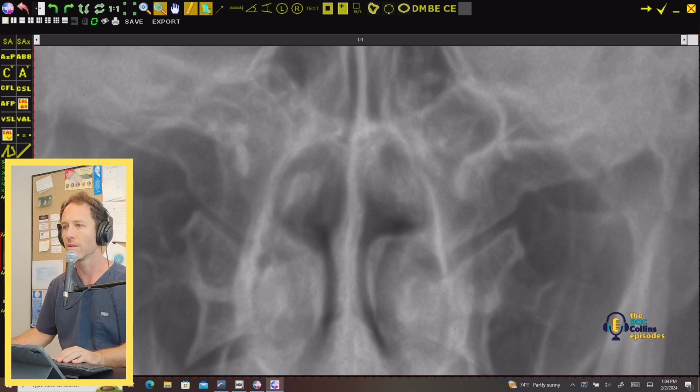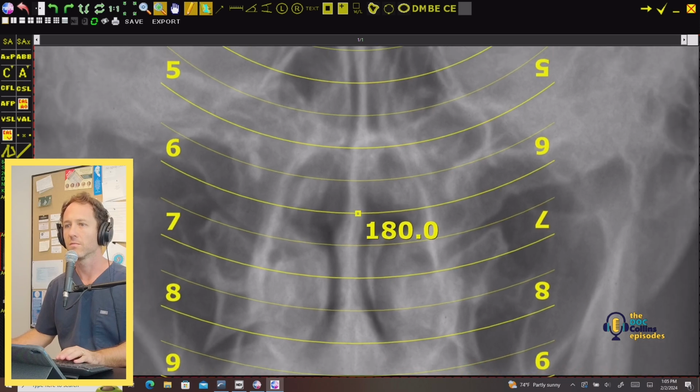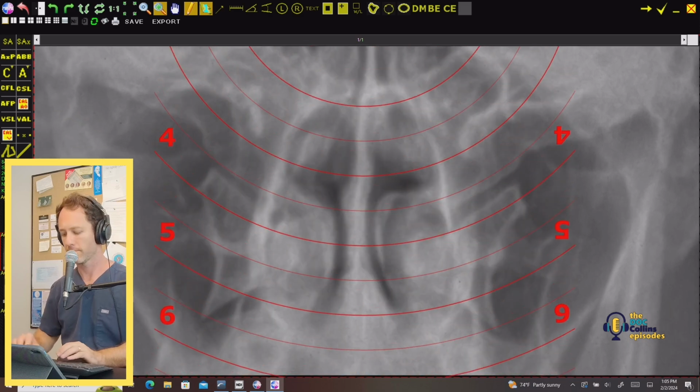And then another one about a quarter of an inch to a half inch medially on both sides. But with software now, we're not dropping a template on there. We can just drop our condylar circle. But for the sake of transparency in the technique, that's how we would do this historically.